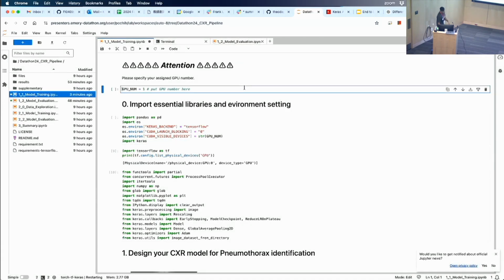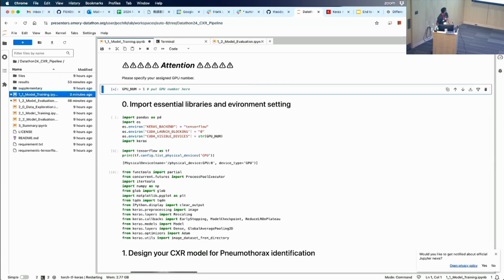But that's just a variable. Huh. Like, not doing anything. Did it run on yours? I think I'm getting this error. I think it's something about the GPU. Oh, about NumPy. Oh yeah, because of the NumPy version.